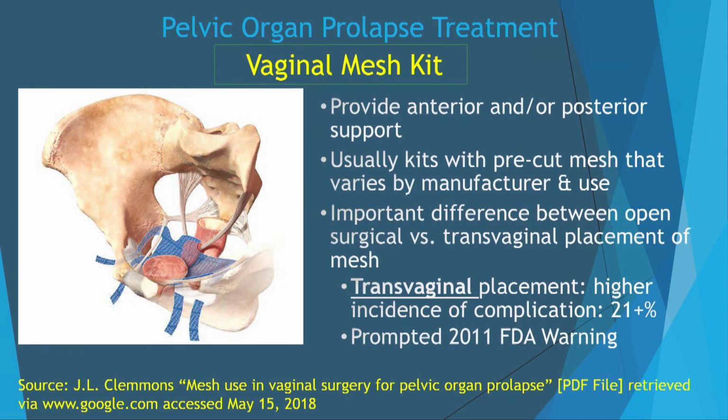Well, now let me turn to the mesh. What does mesh look like with ultrasound? Well, mesh, as I stated before, can be variable. It depends on what organ is being supported. And so in the old days, like about 10 to 15 years ago, surgeons would just take this material and sort of estimate what they need, cut it out themselves, and then put it in the pelvis. However, more recently, we now have pre-cut kits, so surgeons can just fit it into the pelvis, and the shape of the kits just depend on what it is they're trying to treat.